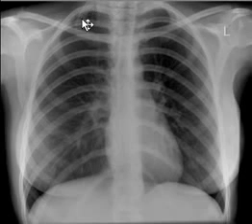So this is the first anterior rib, second posterior, and then second anterior, third posterior rib, and fourth anterior rib, fifth anterior rib, and sixth anterior rib.